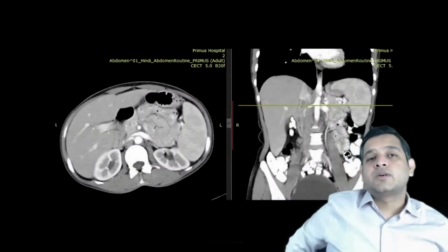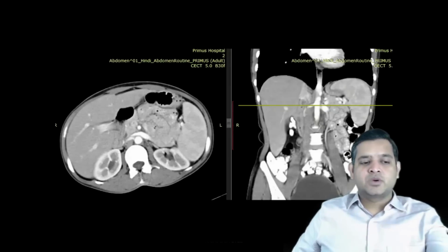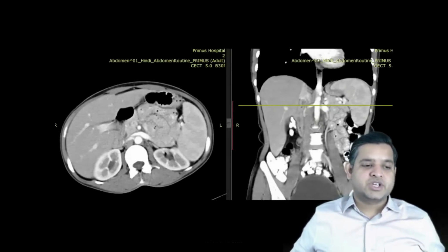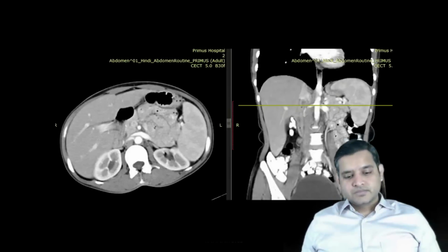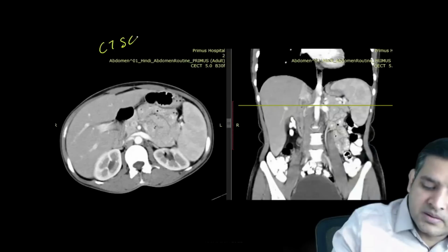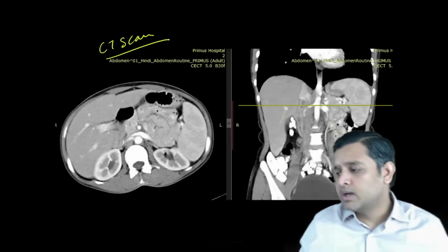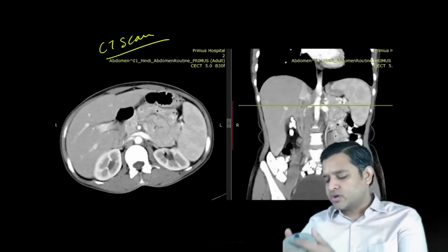Okay. Now from the chest, let's move to the abdomen. And I think in the abdomen also you can identify the name of the investigation. Can anybody tell me what is the name of this investigation? Again, this is a CT scan. So please remember, in the brain, it is not mandatory for you to identify whether it's a non-contrast or a contrast enhanced CT.